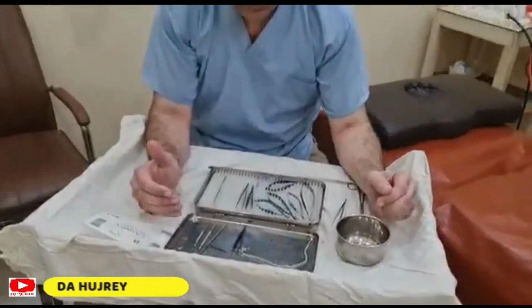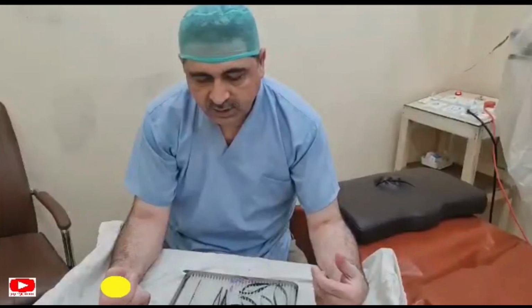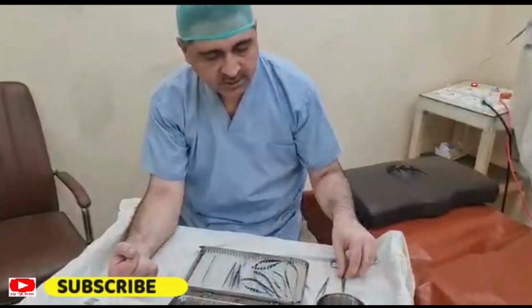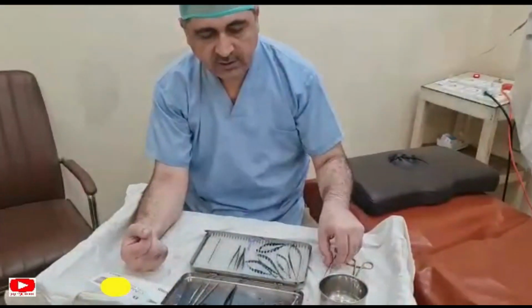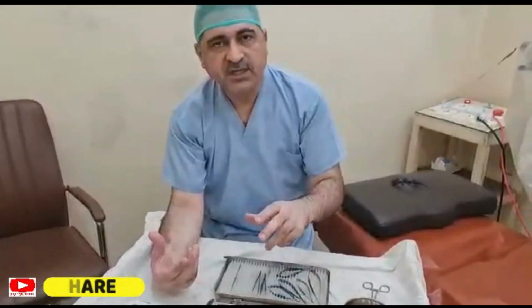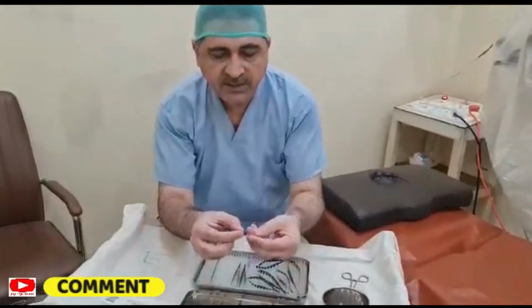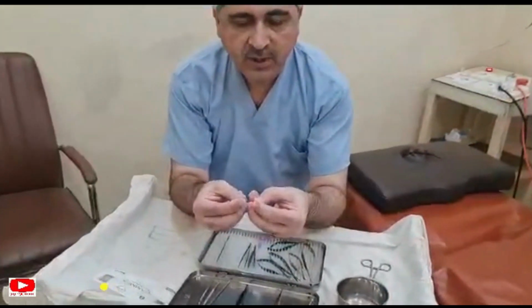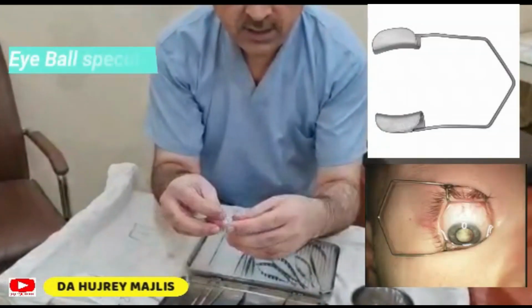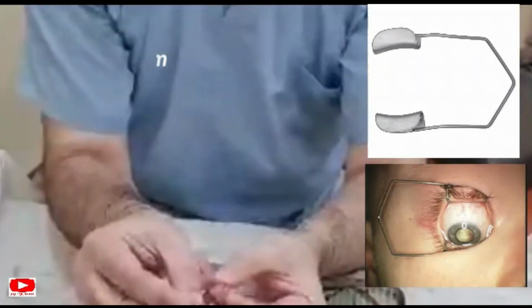Let's discuss the ophthalmic surgical tray. These are the different surgical instruments. I am going to define and explain, one by one, the name of each instrument and its uses. At the top of the list, we have an eye speculum, which we use for the exposure of the eyeball, to retract the eyelids.